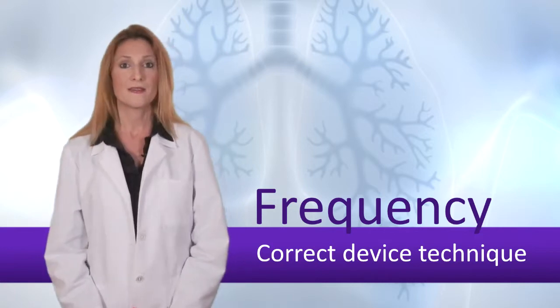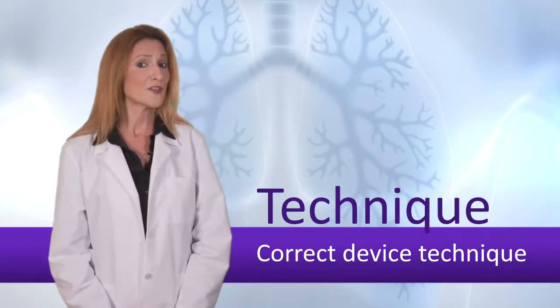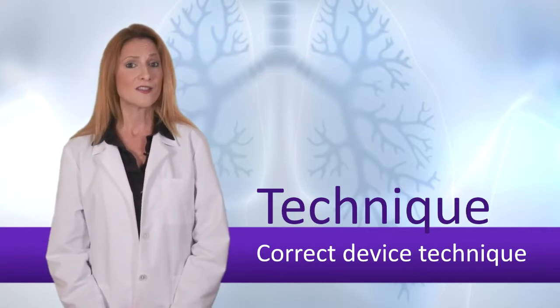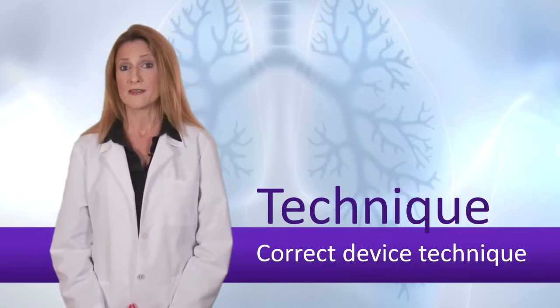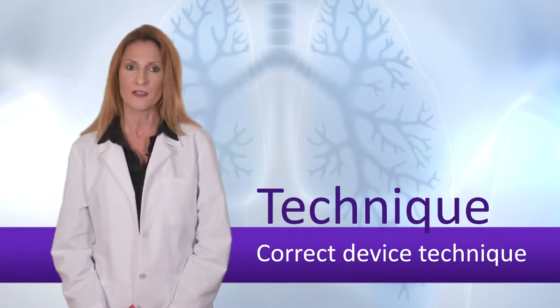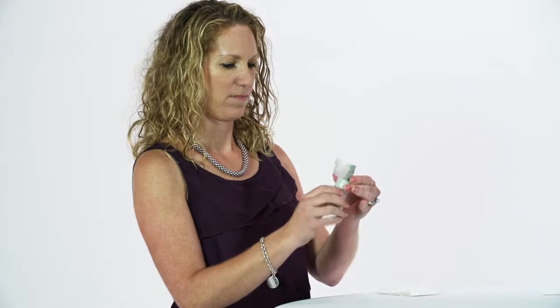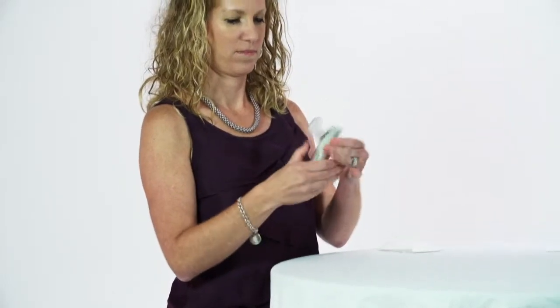insert. Technique. To make sure a full dose is in the metered chamber, the canister is depressed to release the remainder of the dose currently in the metered chamber. The next dose then flows into the metered chamber. 2 to 4 compressions may be necessary to fully prime or fill the metered chamber depending on the brand of inhaler. In general, to prime the inhaler, shake the MDI well for 4 to 5 seconds to mix the propellant and the medication. Then depress the canister to release the required number of sprays. Now the inhaler is ready for use.